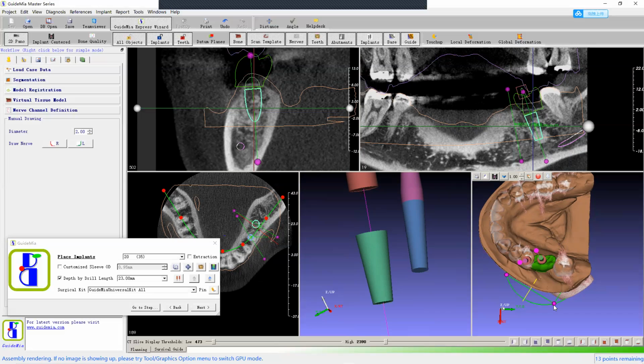I don't have any other option but to just do a cone beam with what she has. In that case, we are doing a radiographic guide for sure. No, there wouldn't be a radiographic guide because it's an immediate placement. She doesn't have any missing teeth.